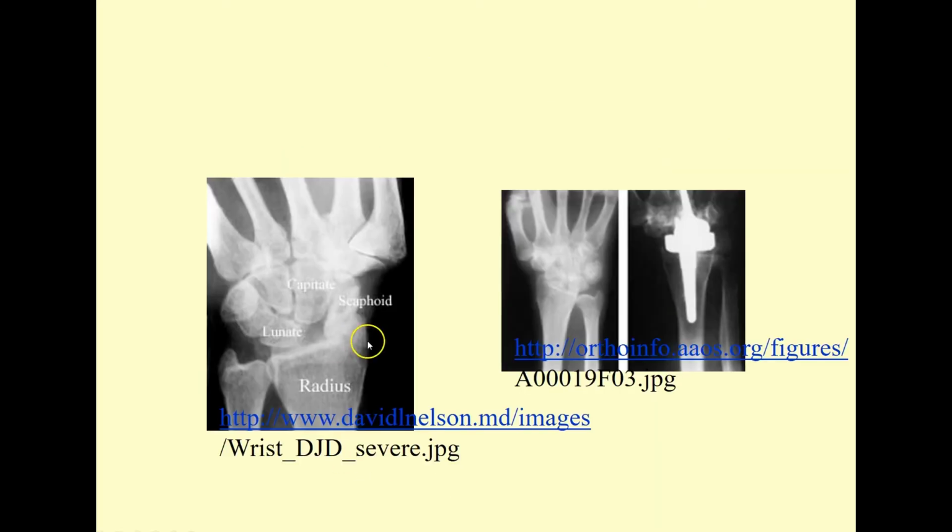more so than plain film. Here we have a very wide gap between the scaphoid and the lunate. This is often the product of a fall, an outstretched hand. The fall will often cause the capitate to kind of split the space here, kind of like a wedge splitting wood, if you will. Prominent loss of joint spacing here, sclerosis that makes me suspect that this is actually on its way to necrosis. Here we have an ulna minus scenario, so the bulk of the joint spacing is between the radius and the carpals. This can set up an environment for increased luxation or dislocation of the lunate.